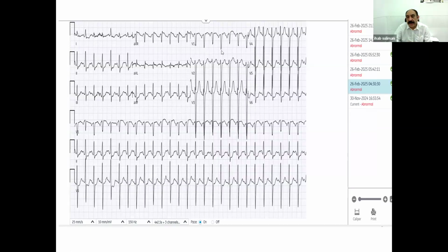So the ECG is showing sinus tachycardia, and I will show you why. It is sinus tachycardia because if we take this, we can see the first spike is the T wave, the second spike is the P wave. So it is sinus tachycardia with prolonged QT, but this is a patient who comes in with thyrotoxic storm, and she's having a prolonged QT and sinus tachycardia.